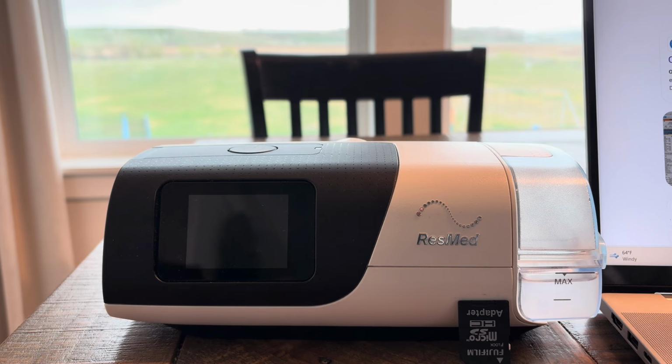So to start off, I have been recently diagnosed with sleep apnea and started a CPAP machine in December of '25, but I got it through a primary care provider, and I've actually never seen a sleep specialist. So everything I've learned has just been on my own, and yeah, we'll just go from there.